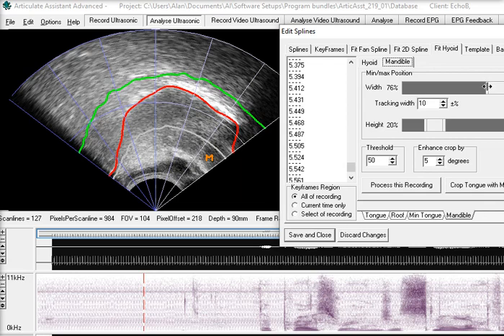Now you've got to set limits as to where it's going to look for tracking, and the tighter these limits are, the better the tracking performance. So we're going to set the range, that's the width or the angle around this fan display, of about 76 to 98% or 99%. So that's from about here to the end, to the right hand side of this display.